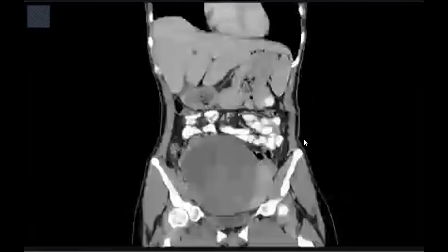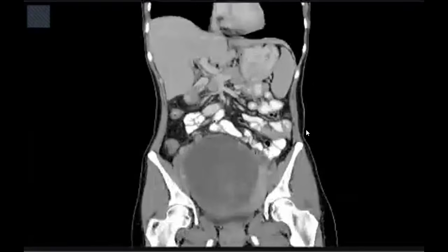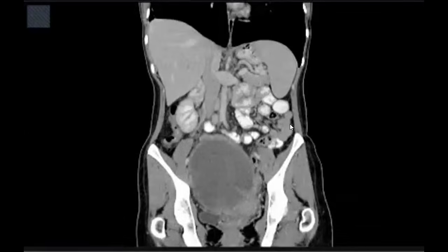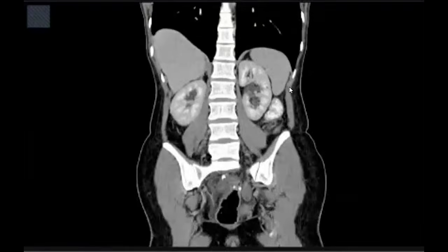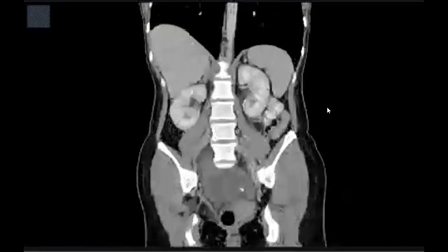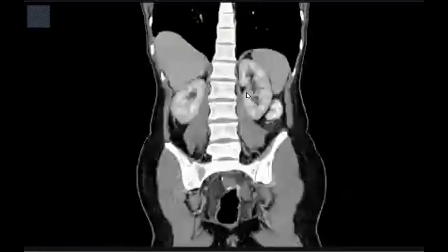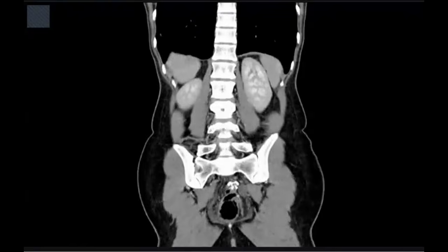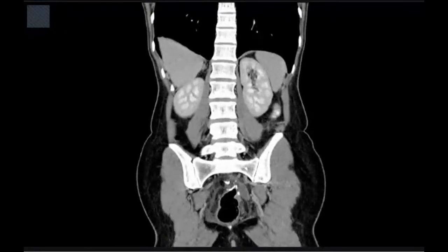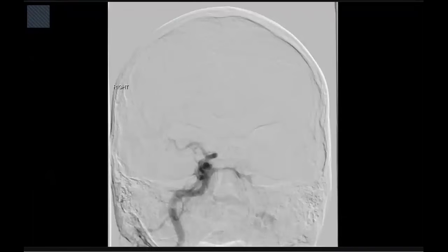So it was a case of Krukenberg tumors. There is bilateral mild hydronephrosis to be evaluated. Maybe the patient needs some drainage, but not so much need for urgent referral to urology. Okay, CT chest, abdomen, and pelvis. Check previous imaging and refer the patient to oncology MDT.